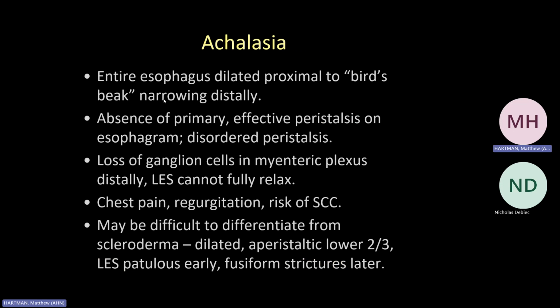The bird's beak narrowing is classic. It is a failure of the LES, lower esophageal sphincter, to relax. Absent peristalsis, food gets stuck, can present with chest pain, regurgitation, and can be, so a couple of mimickers here.